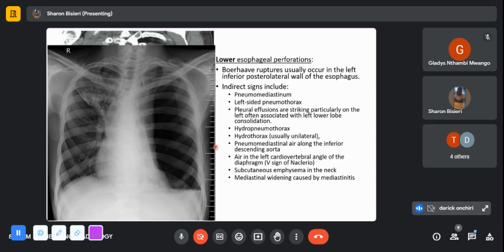It's a discussion we're having today, how to differentiate the AP and PA. I would look at the clavicles and the medial ends of the scapula. But now, most importantly, as much as we were mentioning the findings, especially on the right upper lobe, I was thinking there was some element of rotation for this patient, more to the right.